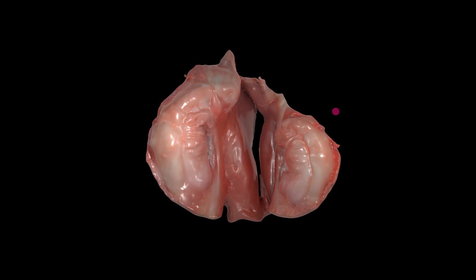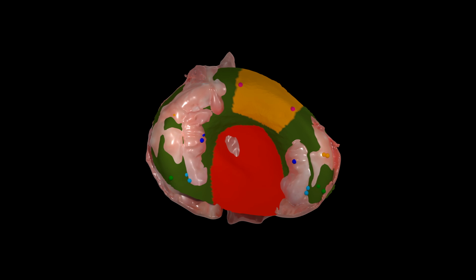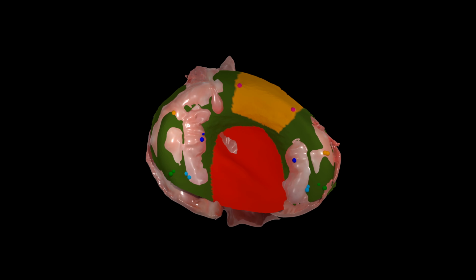We adopted DiffusionNet, a neural network for general 3D surfaces, to predict the positions of 10 landmarks in a custom two-stage process for increased precision. Utilizing these landmarks, we register a segmented template to the input scan via the non-rigid iterative closest point algorithm.